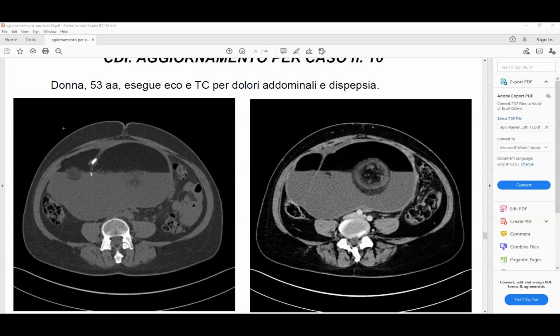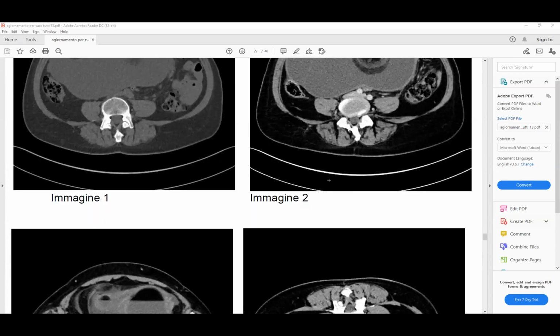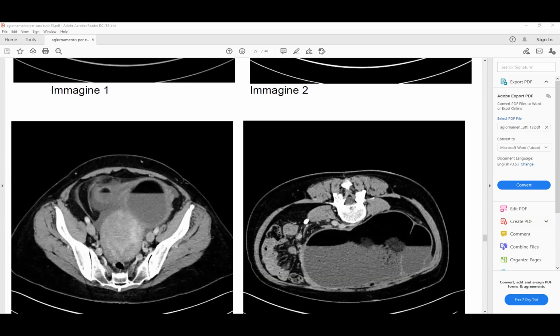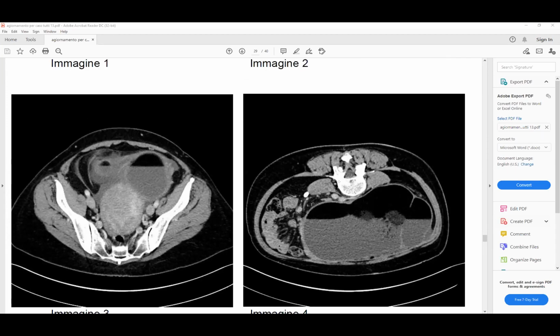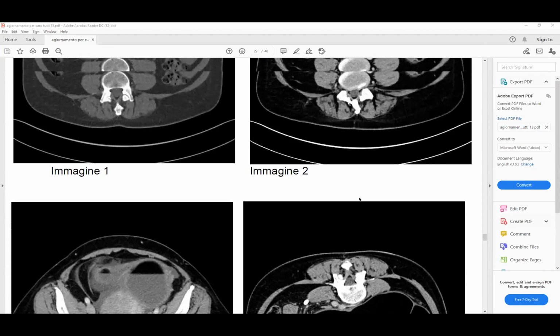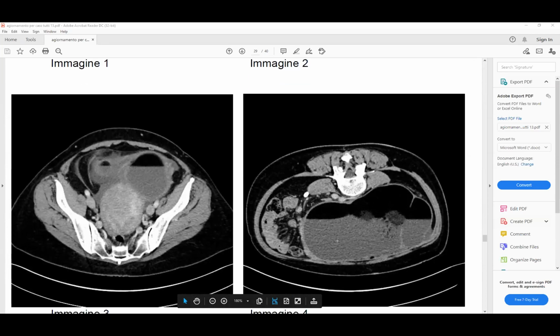And so we saw here, this was the mass with the calcification. Can you see that? Yes. And what was interesting is that we also scanned the patient in a prone position, and you can see that the fat component goes up very quickly compared to this image. Francesca, go down. When I was reading about it, I heard about something called floating nodules, or the meatball sign, and your case actually has that. See those little nodules in the middle floating?